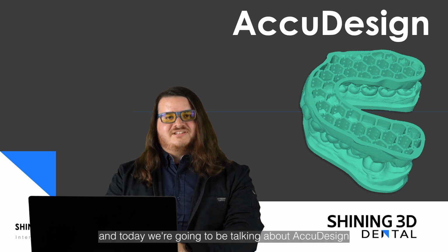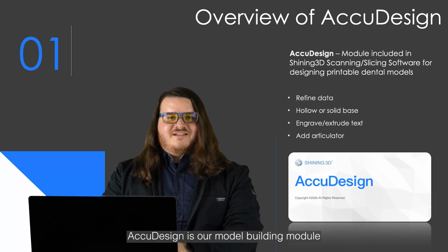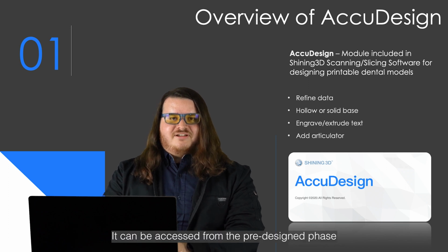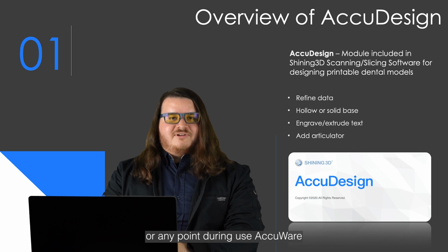My name is Chris, and today we're going to be talking about AccuDesign. AccuDesign is our model building module included with our scanning and slicing software. It can be accessed from the pre-designed phase of the scanning softwares, or at any point during use of AccuWare.